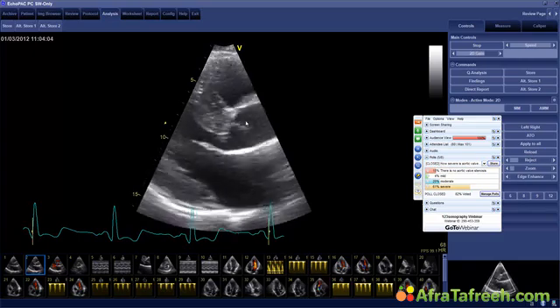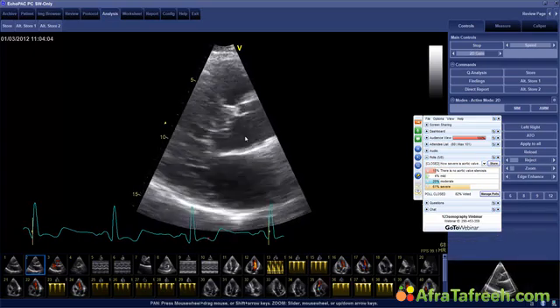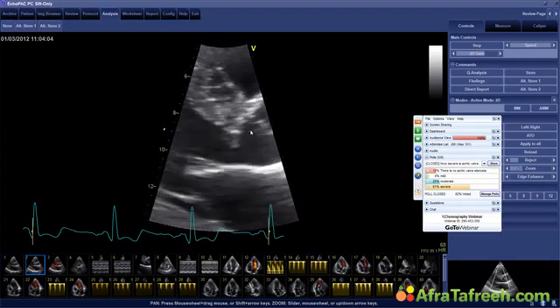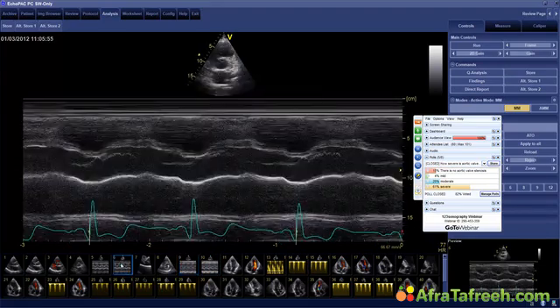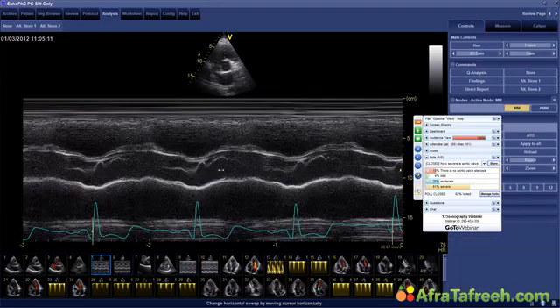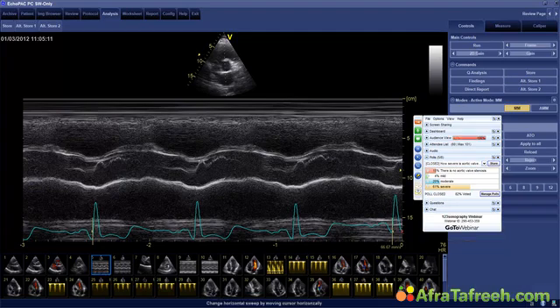The only thing that I want to point your attention to is the flutter motion of the aortic valve. Do you see how the aortic valve flutters? You can see that in M mode as well. Let me see if I can find the M mode of the aortic valve. Here it is. You see flutter waves and you have early systolic closure of the aortic valve, partial closure. This is caused by the obstruction, by the high velocity flow which hits the aortic valve and thereby kind of closes it and causes the aortic valve to swing.